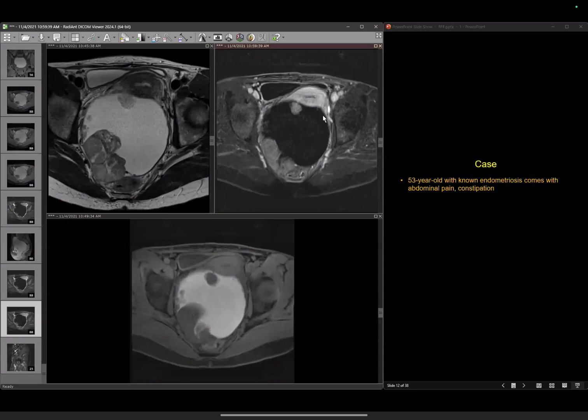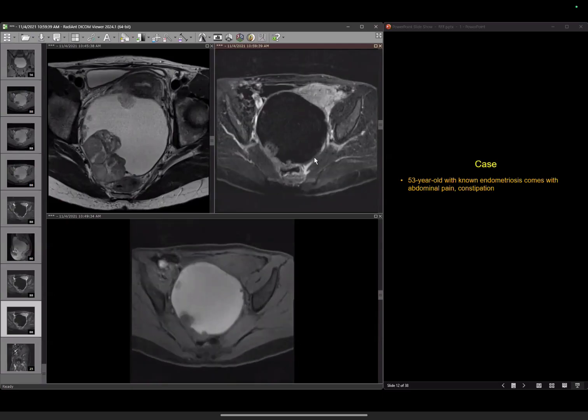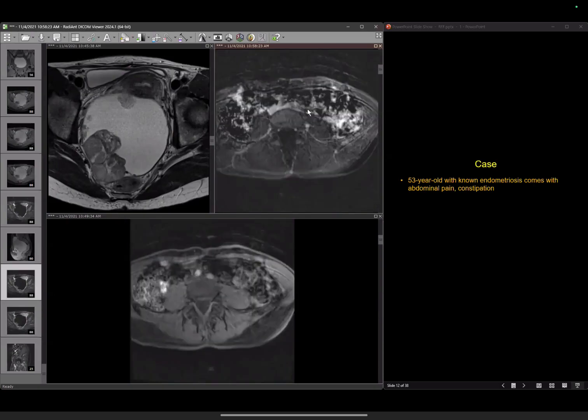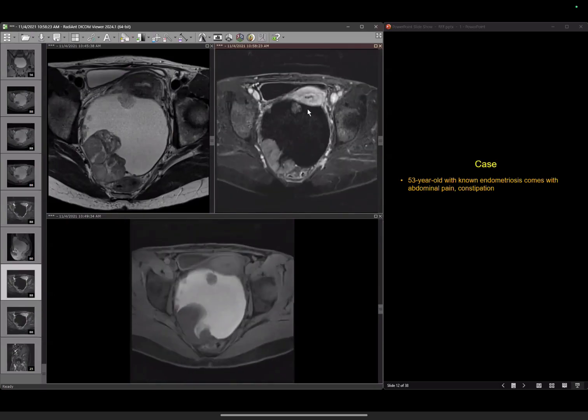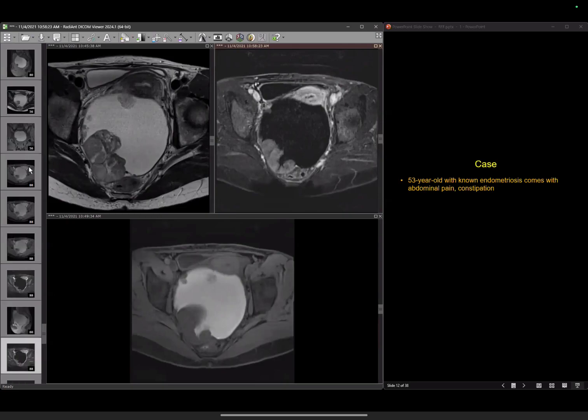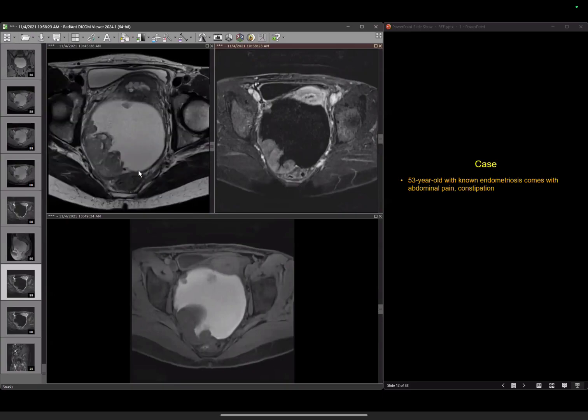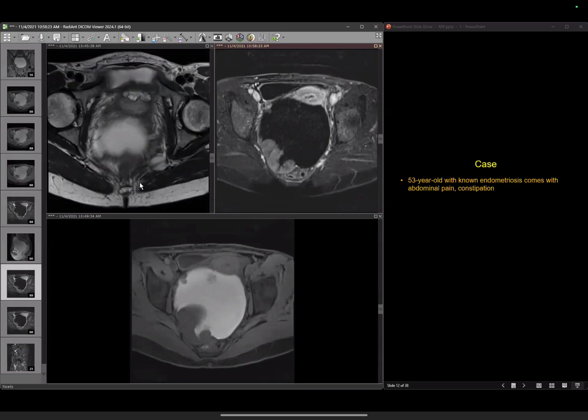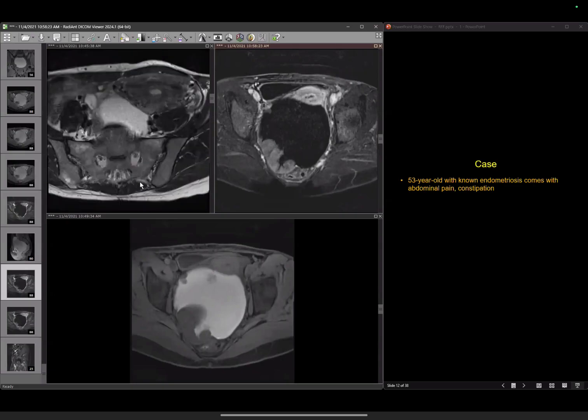You can see the uterus is enhancing, and so this is post-contrast subtraction. Here is a slightly earlier phase. And what else would you like to see? So I will describe the image. Go ahead. So tell me, first of all, what do you see? Where is it located? And what are some of the things that are going through your mind?